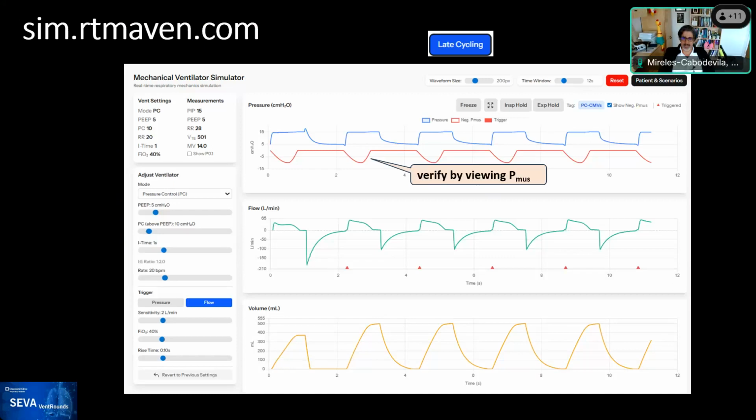It's an Excel thing. No, it's a limitation of my programming skills and time. So if you want to see something more realistic, something that's animated and dynamic, like a simulator like this, then you can see anything that you want to see.